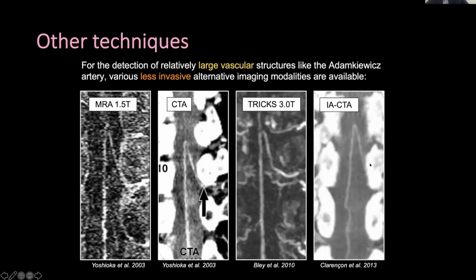Just to show you that our technology is getting better at cross-sectional imaging. We can use CT angiography and MR angiography to depict a lot of these vascular structures, which were only really feasible using angiography. Nowadays, what we'll typically do if there's a clinical suspicion of, for example, a dural AVF, we'll perform an MRI and an MRA first.